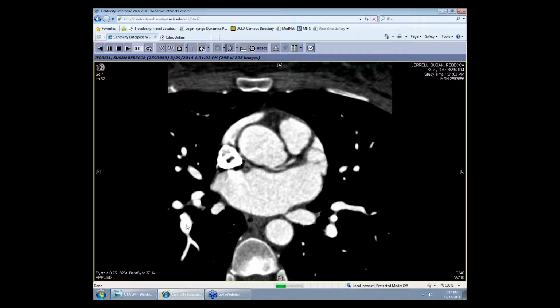The problem of the CAT scan is it doesn't distinguish between intramural and extramural course, but it suggests that it's an acute angle. That's indicative usually of intramural, but it's not proof. Nor can it show you the severity of stenosis, nor the mechanism, whether it's by hypoplasia or by lateral compression.